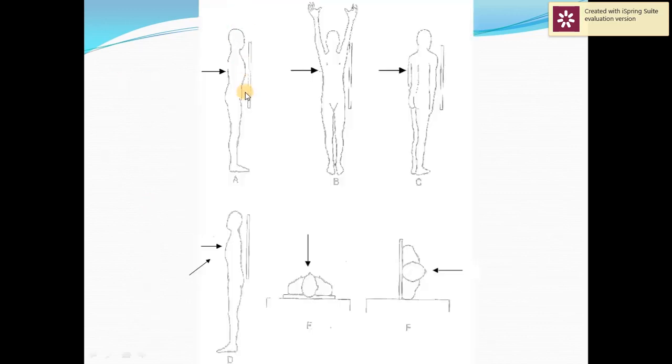زي ما احنا شايفين هنا this is the PA view and this is the lateral view, this is the AP anterior posterior view and this is the left or the right lateral decubitus.